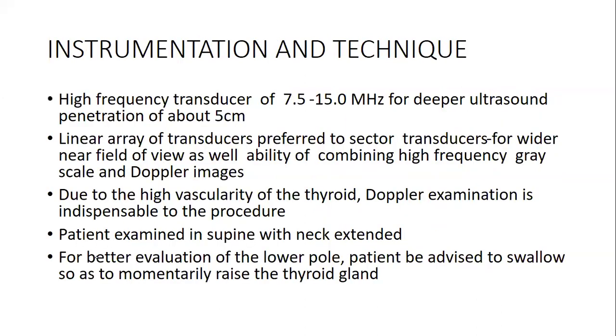Now, in terms of instrumentation and technique in imaging the thyroid gland, we recommend a high frequency transducer of about 7.5 to 15 megahertz for deeper ultrasound penetration of about 5 centimeters.